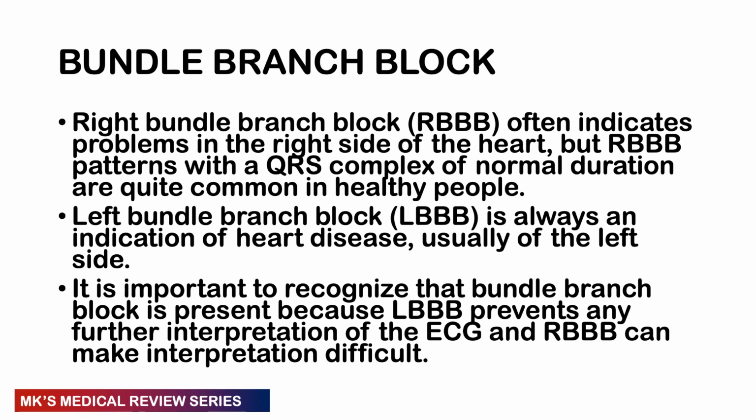So when you talk about right bundle branch block, it's simply blocking the right bundle branch. This is going to mean that there's a problem on the right side of the heart. Most of these patterns are going to be seen with a QRS complex which has a normal width, and it's actually quite common in healthy people.